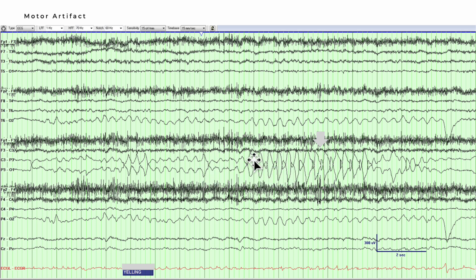You can see again, this is not a physiologic field. That's a key part to identifying this type of motor artifact, whether it's a tremor or otherwise. As you see, this is maximal in the left posterior parietal region, but also it's maximal in the right occipital region, and its field is huge here, and then you really don't see it at all in the left central region. So it doesn't have a physiologic field that would spread out as a typical discharge would amongst electrodes surrounding the brain. And so this can be identified successfully as an artifact.